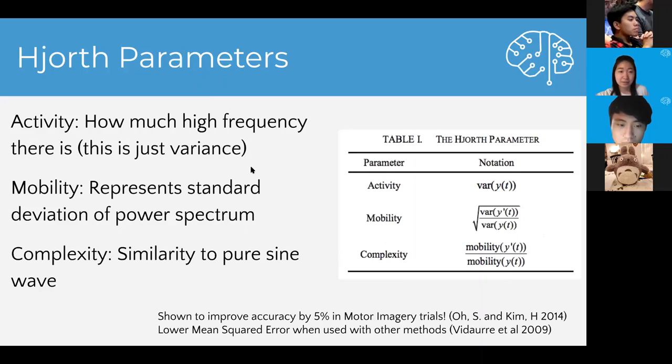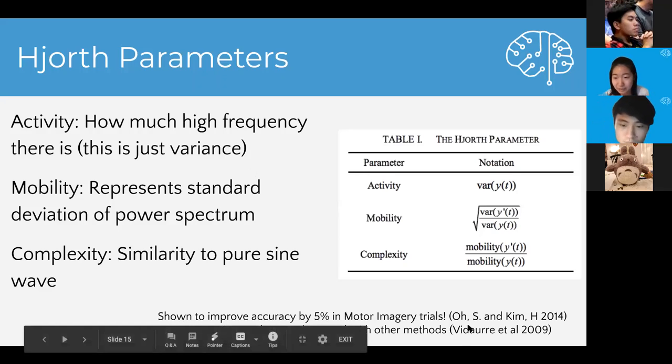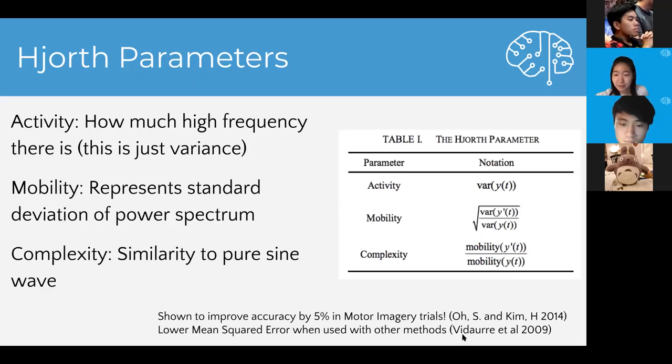And the good thing about using the PyEEG library is that you don't actually have to calculate it. You just give it the signal and it will calculate the values for you. But there's a lot of good math behind this, and you can see it in a lot of these papers. They explain the different parameters pretty well with the math. So we encourage you to do that too.